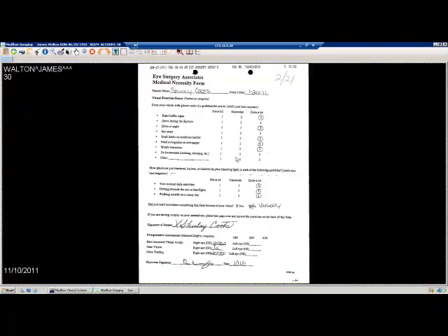If you've changed the image by using the magnifying glass and you wish to bring it back to the normal view, you can select the reload image icon up at the top of the screen. If you wish to rotate the image, you will use your arrows. Please take note that the image will need to be selected before you can make any changes to it. You'll notice when selecting the image, there's a yellow box lined out on the outside of the image.